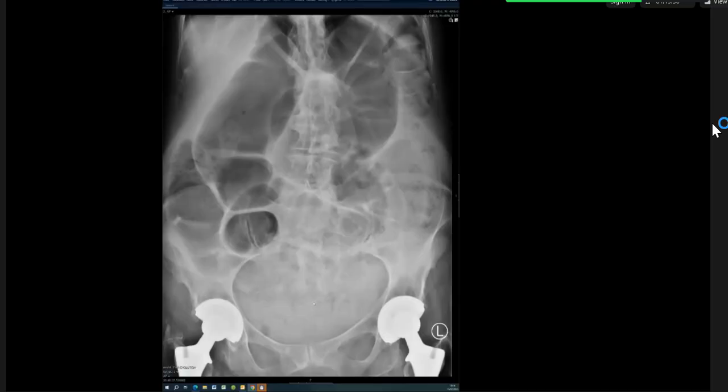Maybe the distended bowel in the center of the abdomen corresponds to the transverse colon, because I can see, I don't know if you can see my pointer or not, but I can see it approaching the course of the left of the transverse colon and traversing in the left paraspinal region. This may be corresponding dilatation in the right colon and in the transverse colon too. Okay, so I'll move on to the CT and then I'll come back to the X-ray to explain.